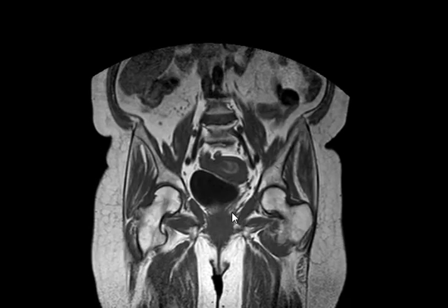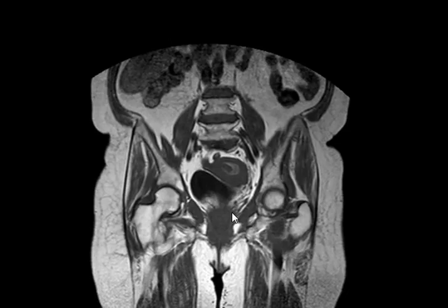Also there's hyperintense signals. What does this hyperintense signal mean? It is T1, it is blood. It's blood. And there is a central lesion. The center of the lesion is also hypointense in comparison to the T2. We see it hyperintense. So I think it is malignant.